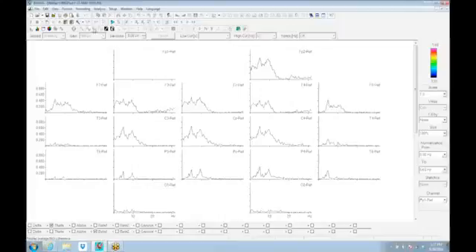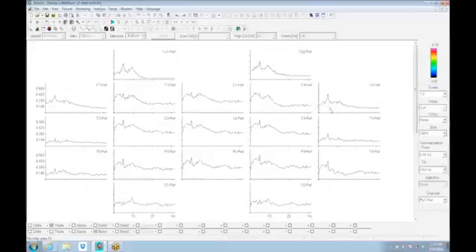Got it. I usually find the pairwise coherences are better than not looking at how something's connected. But how things are connected on the average coherence is, I think, more like a multivariate. And when I look at coherence, this is what I look at to see whether something is over-connected, under-connected, or not active.